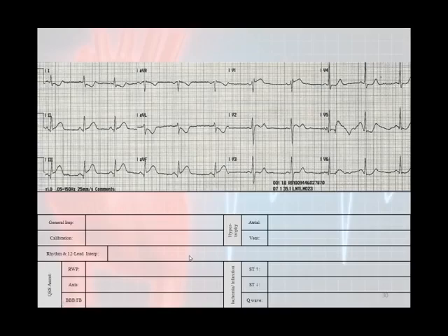Did you see anything that was excessively fast, excessively slow, or any ugly morphologies? Well, if you look at the rhythm, it doesn't look like you have any excessively fast or excessively slow rhythms, but it does look like we actually have some ugly morphologies. If you would look over here, that looks like an ugly morphology. These look like ugly morphologies. This over here is actually maybe patient movement or something, so you can't really use that as a problem. But anyway, this does have some ugly morphologies.